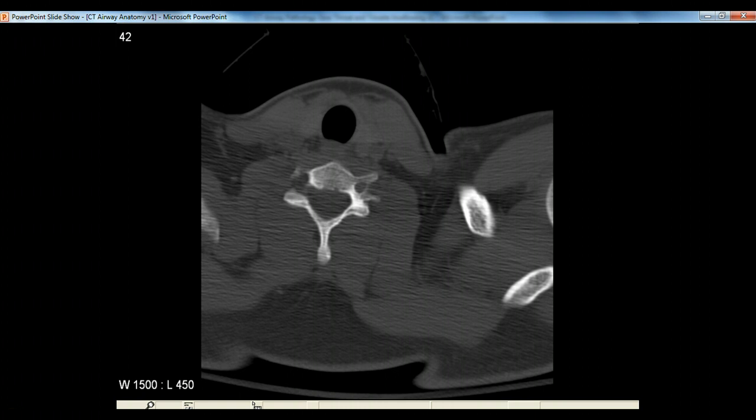And we're in the neck right here. So while you're pushing on the back of your neck and you feel like you're pushing on the spine, this is just above or just about at the level of the shoulders. Your spine is really deep there. And you see some other structures too on here. So to the left, the patient's left, you see that bright white structure, that's the clavicle or collarbone coming through, and the farmost left and posteriorly you're starting to see the top of the scapula or the shoulder blade.